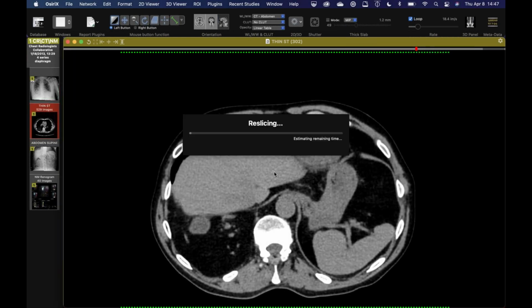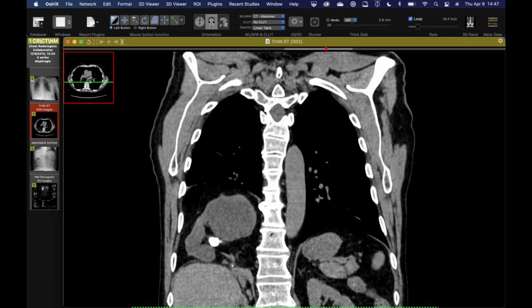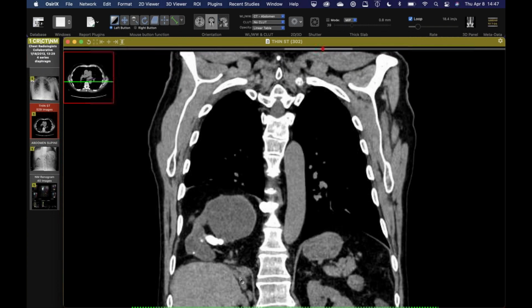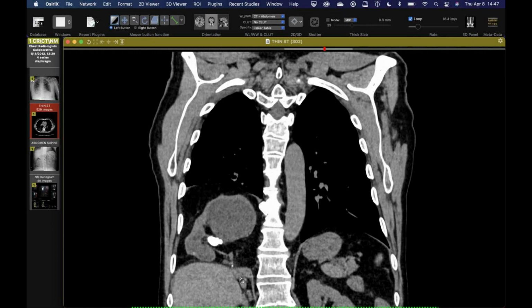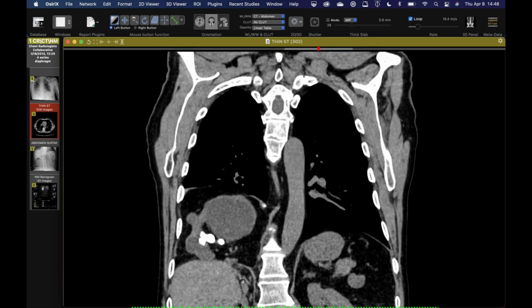Let's see if we can look at it on a different plane. Yeah, it's pretty tight in there. I didn't have anything older, but this goes back about 8 years of imaging. So it's been sitting up there and mostly non-functional. It probably is torqued around and twisted too. So yeah, that could contribute to some obstruction.